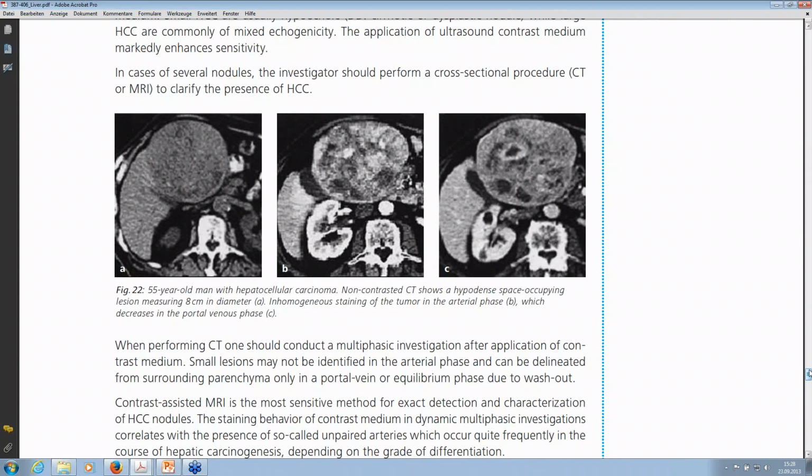But there should not be a tutorial on liver disease without the hepatocellular carcinoma. One of you would like to describe that? Well, there's a CT scan with 3 pictures where we have a diffuse hyperdense mass in the liver, which is not clearly shaped in the round part, but completely diffuse, not capsulated, if you compare it to the benign lesions we have.